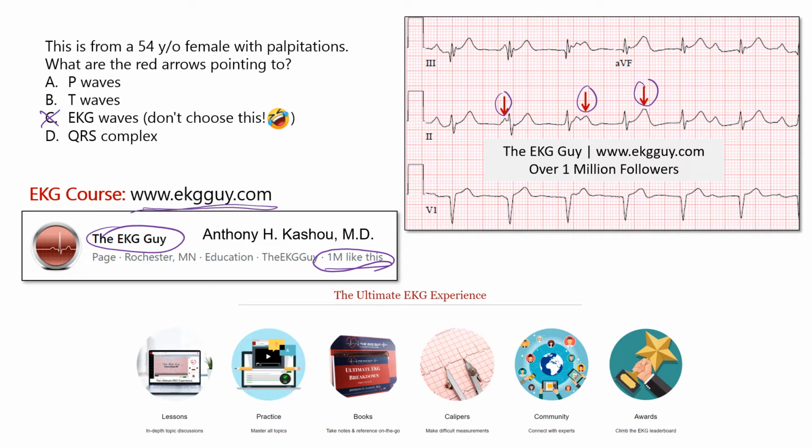All right, so back to the question. Our 54-year-old female with palpitations having this. So what do we see here? Well, the answer is P waves, and let's see why that's the case. Notice that you have this P wave, and then it seems like a PR segment, this QRS complex, and then a T wave. And then all of a sudden our P wave is not where we expected it. Notice that it is actually coming closer to our QRS complex.